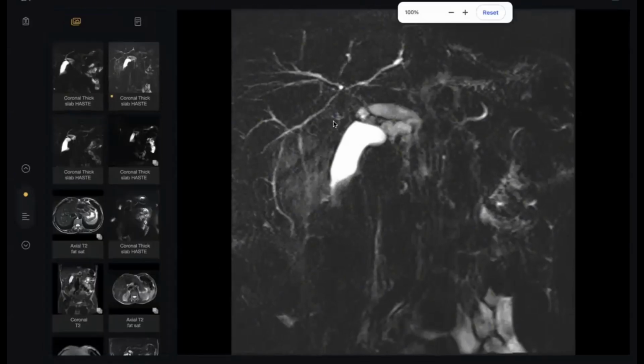In between the gallbladder and the CBD, I'm seeing some soft tissue intensity. This is MRCP, so concentrate only on the biliary tract. There appears to be some anomalous origin, meaning some variant, like a trifurcation of the right and left biliary radicles, it seems.